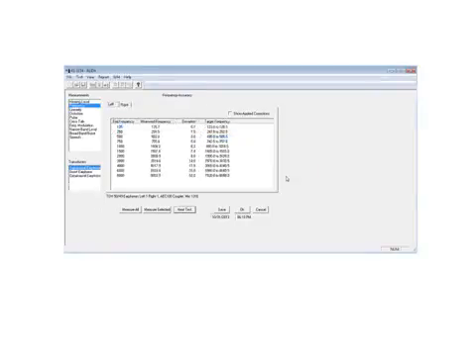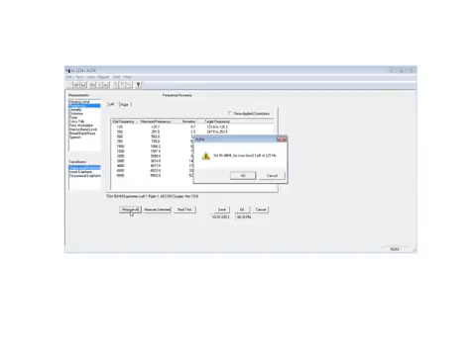And as it sets up the next test, then again, we could hit Measure All. With Measure All, the system starts at 125 hertz and will automatically step through all the frequencies. It also prompts the operator to set the proper dB hearing level, in this case 80 dB hearing level, to do the frequency tests as the standard requires.